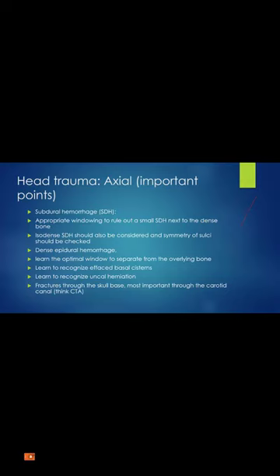As we look for subdural hemorrhage, everybody should be aware that there is a subdural window. When you click that subdural window, it makes it possible to see the subtle difference between the brain parenchyma and the slightly hyperdense, maybe thin line of subdural or epidural hemorrhage that is sometimes so dense you might not be able to discriminate it from the adjacent calvarial bone density. So specifically considering this subdural window is important.